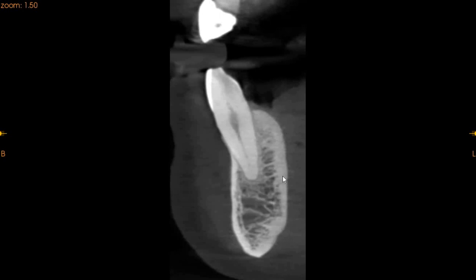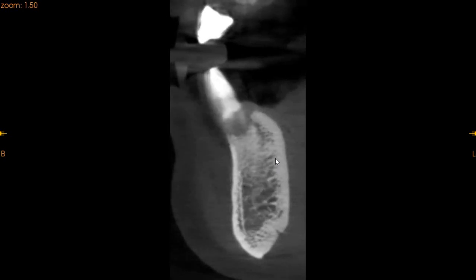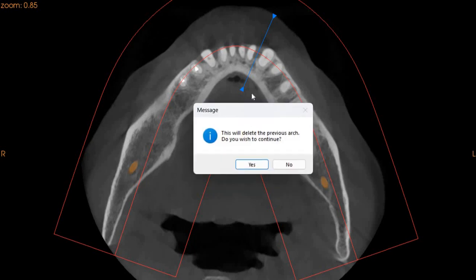Moving to the lower left canine, here you can see that we have adequate anatomy in the canine. The canine has wonderful bone support, and we don't see any major periodontal disease associated with the canine. However, we do see this punched out lesion right next to the lateral incisor and the canine in the lower left region. Now we'll show you the teeth from an axial view. There we go, that's the axial view.